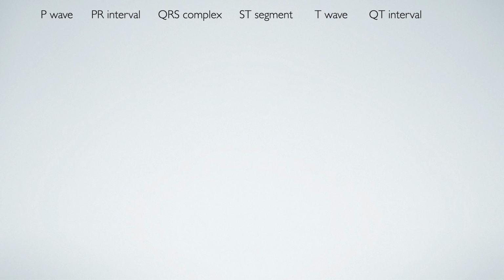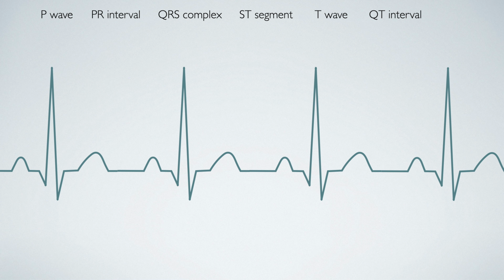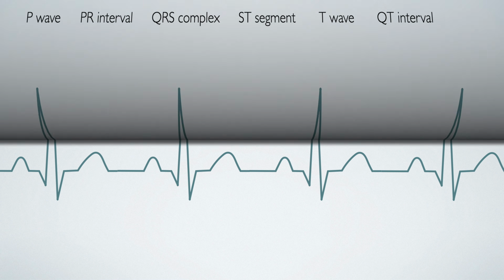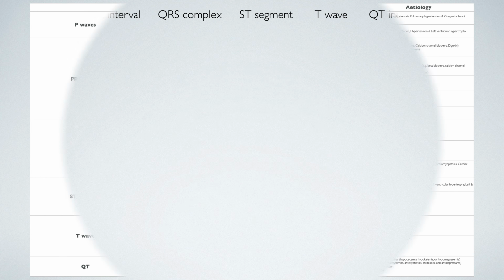And this brings us to the end of today's episode of the Learned Medicine Show. Here is a summary of all of the ECG presentations we have reviewed and the ECG criteria. You can screenshot this with your phone and keep it there for revision.